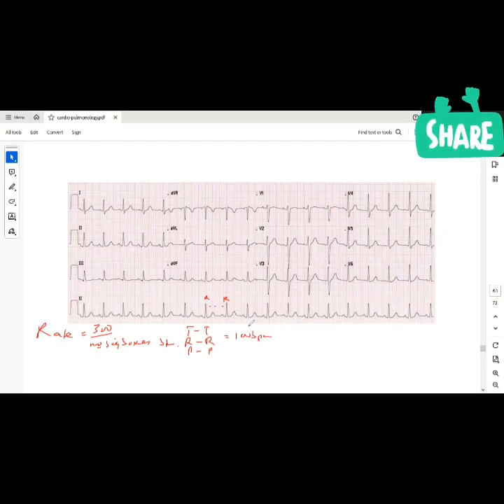So how many big boxes between the waves is normal? Typically 3 to 5 is normal. If I count the number of big boxes and it's 3, that's 100. And if it's 5, that's 60, which is within the 60 to 100 heart rate range. Make sense? So any number above 5, I'm dealing with a slower heart rate. Any number below 3, I'm dealing with a rapid heart rate. Make sense? Okay, so that's the quick estimate.